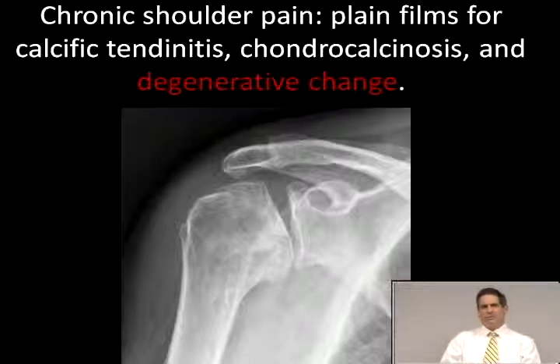Note that since your shoulder isn't a weight-bearing joint, it's generally held that, at least in patients that aren't paraplegic or amputees and use their shoulders as weight-bearing joints, typically, if you see significant osteoarthritis in the shoulder joint, you should probably think somewhere along the road of processes provoking that early degenerative change, such as a fracture, as we just saw in this case, repeated hemorrhages into the joint, hemophilia, other processes leading to repeated hemorrhages because blood and joint cartilage don't get along.